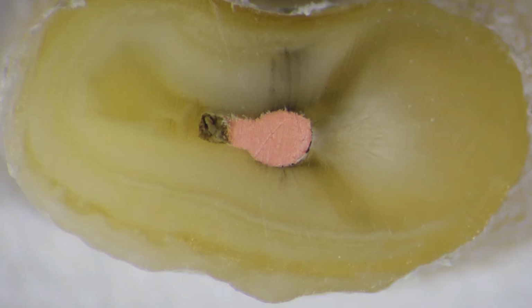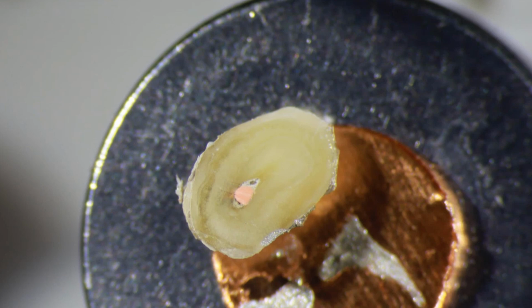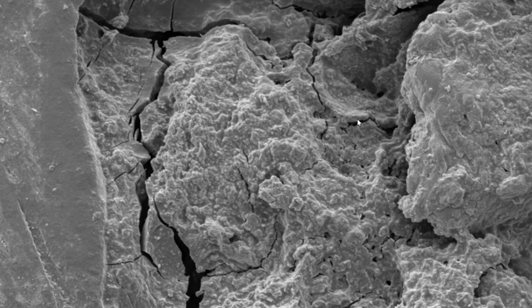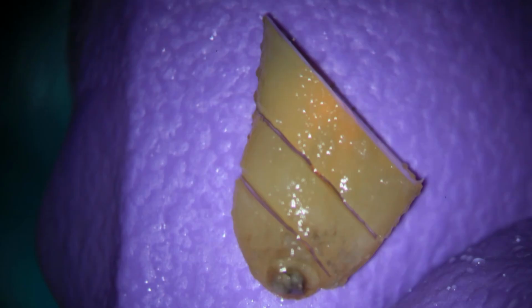This is the second section. This is how we sectioned the root and then split it. And this is section number 2, and you can see the area that hasn't been filled where the oval is. And we looked very carefully at what all that material could be. And again, it's just a very, very extensive biofilm. So looking at these with the electron microscope is very, very powerful. You get a different sense of what's really there.